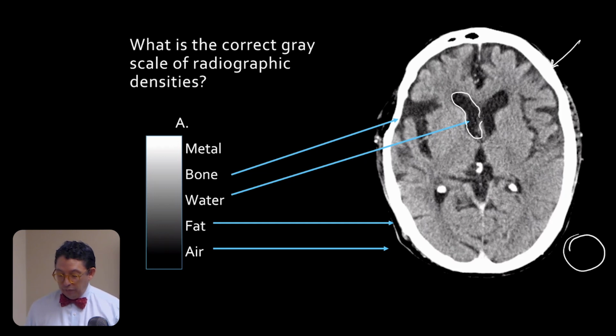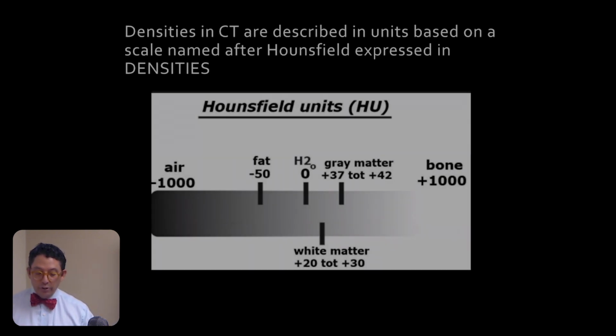If you look outside of the body, even though I'm going to talk about windows later, you see that there's a slightly different density in the fat, in the scalp. You cannot see it clearly here, but once we identify what windowing is in CT, you'll see that's really there. Your eyes cannot detect it easily. But this is how we look at all these densities in our day-to-day.